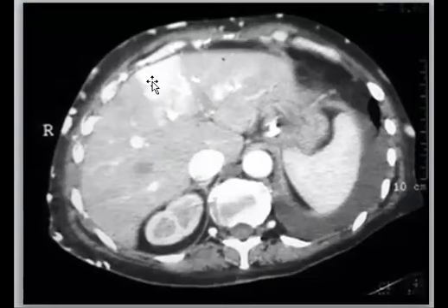So this is very famous in the exam as a short case. What is called the hot liver sign, hot spot sign, and they denote that there is superior vena cava obstruction. You mention it, this is what's called the hot quadrate sign, spot sign. So this is seen in the technetium sulfur colloid scan.